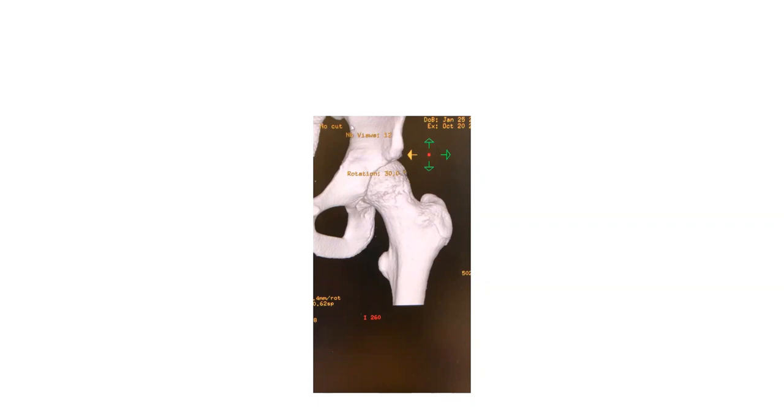Because you get called to the ER, you're the intern now, you get called to see this fracture. They have one picture for you. What do you want to order? You want to order a complete set of x-rays, AP and lateral view. You also want to image the joint above and the joint below. Okay, and that's generally a good principle. And as a student, that's what you should suggest.